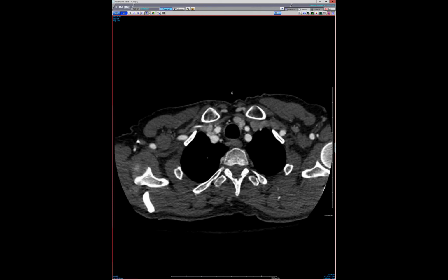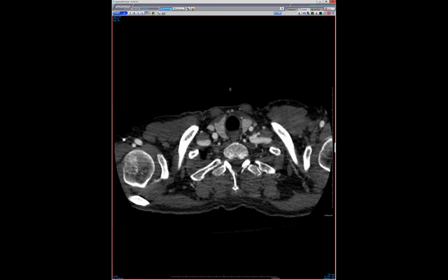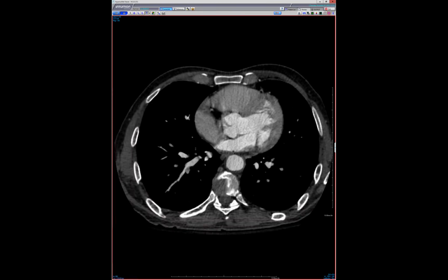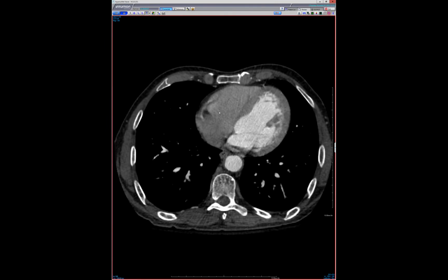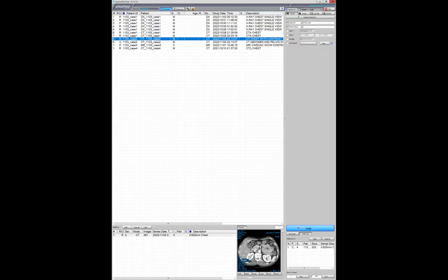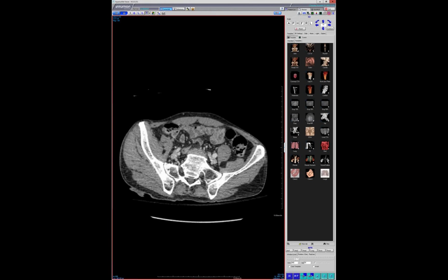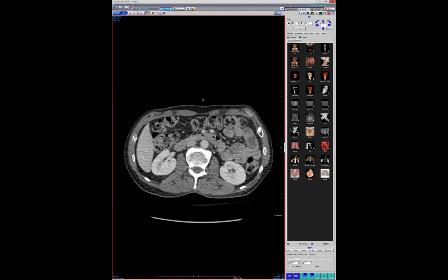But if you go to the arch vessels, they're completely clean, except for maybe the ostium of the left subclavian here. I know we don't see the coronaries very well, obviously, but there's no hint of atherosclerotic disease here. And the portions which we do see kind of well, like the RCA here, look completely normal. And then go into the belly. How old is this person, Seth? He's about 65. So go into the belly, and you can see, again, the circumferential thickening.